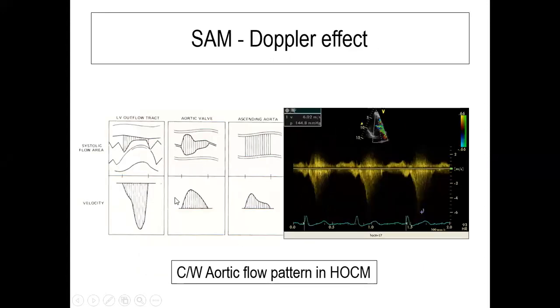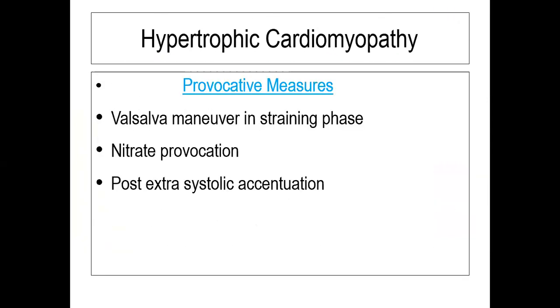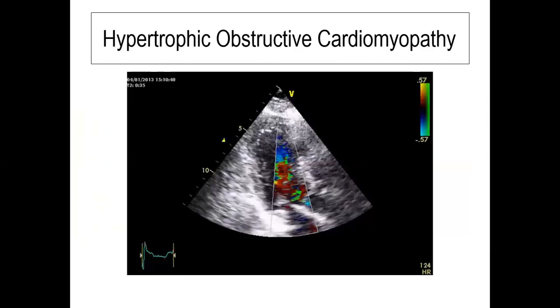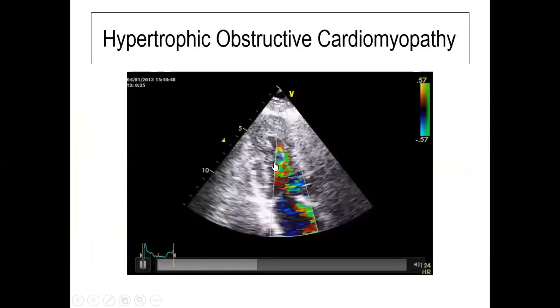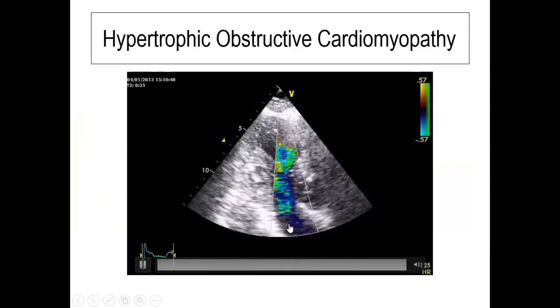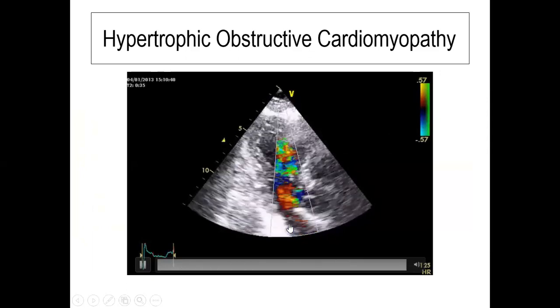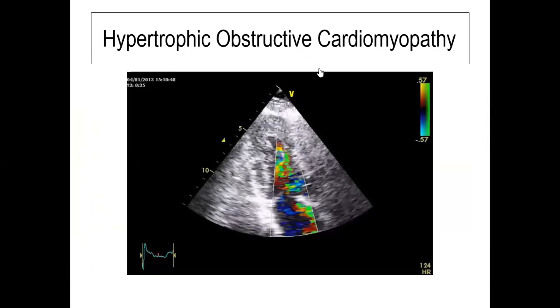This is the thing which I have shown. This is systolic forward flow in the ascending aorta. And this is hypertrophic obstructive cardiomyopathy. And this is a classical example where you see a lot of turbulence in the LVOT area. And look carefully, we are having some amount of MR seen over here. Not as classical as what I showed, but this is how obstructive cardiomyopathy will look when we are talking of all these things.